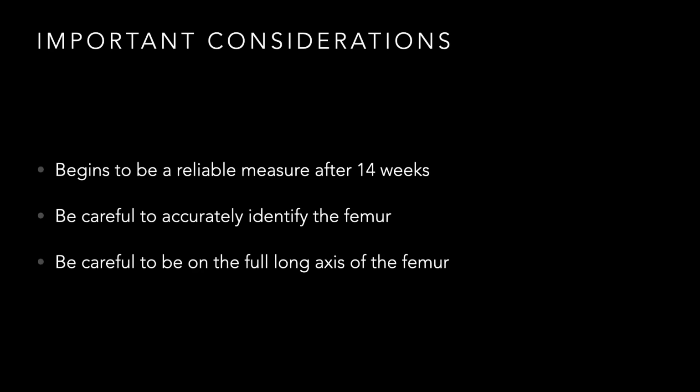Again, some important considerations here. It tends to be reliable after about 14 weeks, right? I didn't find anything that definitively said that reliability falls off later on in pregnancy. But to me, it makes sense that the accuracy is going to fall off as we get further and further advanced in the pregnancy, just because we know that some people have longer legs and some people have shorter legs, and there's going to be more variability as we get towards the end of pregnancy.